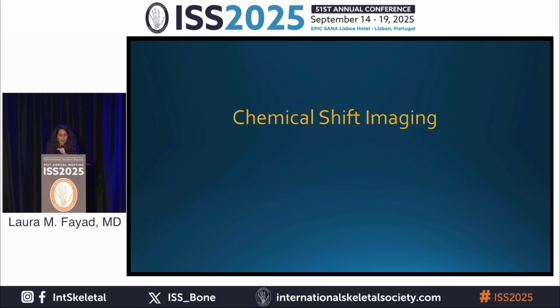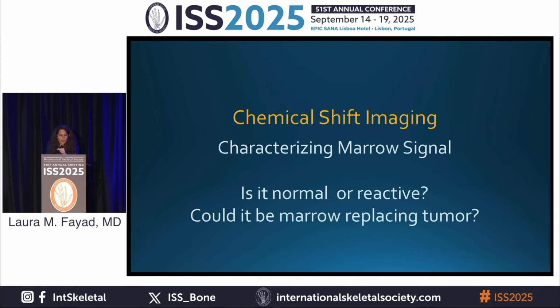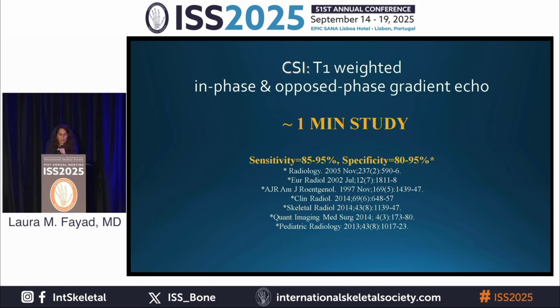And to answer this question, we turn to this sequence, which is designed to exactly answer that question, to characterize this marrow signal. Is it normal, or could it be reactive bone marrow edema, or could it be marrow replacing tumor? So we'll talk about T1 weighted in-phase and opposed-phase gradient echo chemical shift imaging, a very fast sequence. It's based on the premise that protons attached to lipid and water precess with very similar yet slightly different frequencies.